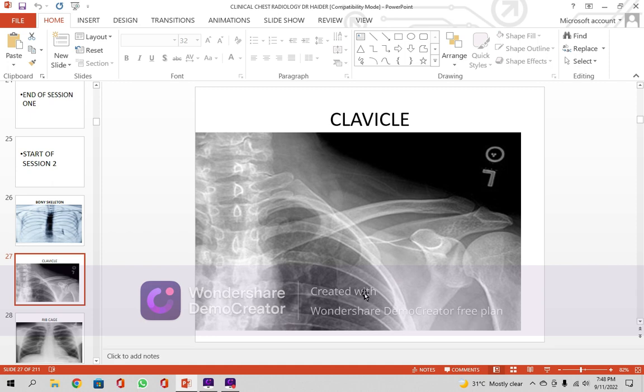Because if there is density here, a pathological radiopacity, it will be masked or isodense. So its opacity definitely cannot be defined, and the X-ray will be regarded as normal. So it should not be under this, more than 2.5 centimeters. It should not be under this.